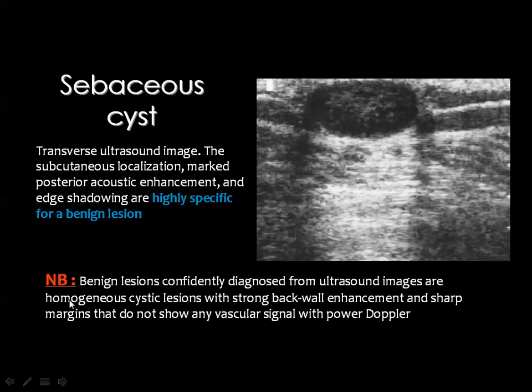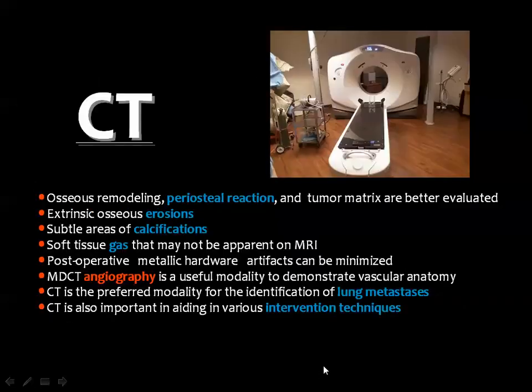The benign is a homogeneous lesion which is usually cystic with a strong acoustic enhancement and sharp margin with no abnormal vascularity on Doppler study. This is a confident diagnosis by ultrasound that this lesion is a benign one.